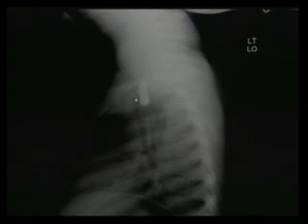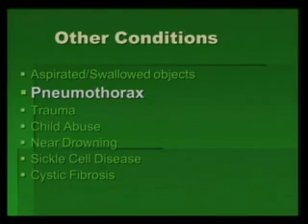But here, the good thing for the gastroenterologist is when he goes and scopes them and removes this, he gets a tip. He can use it, that's the tip. So he's hoping they're quarters, but a lot of times they're not. They can be batteries, and that was not good. The worst thing to swallow nowadays, well, everything is bad to swallow, but you sure don't want to swallow magnets.